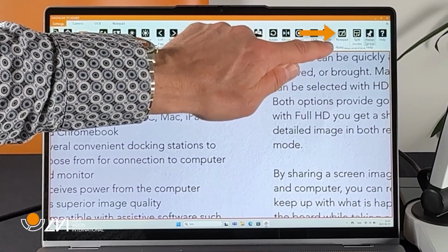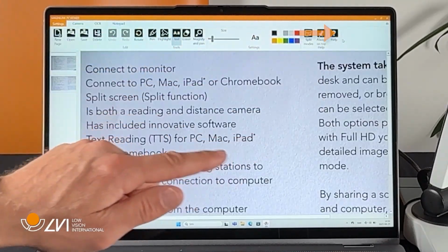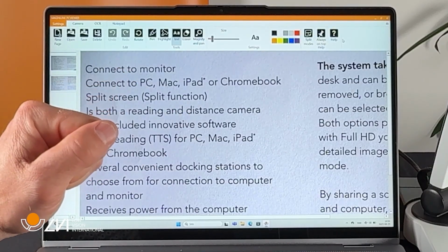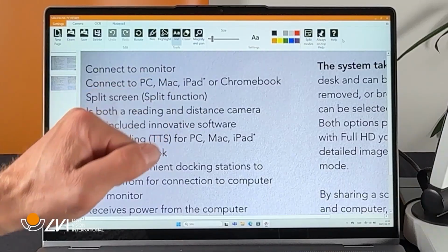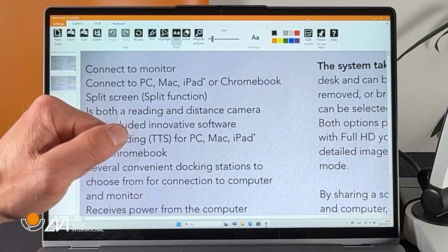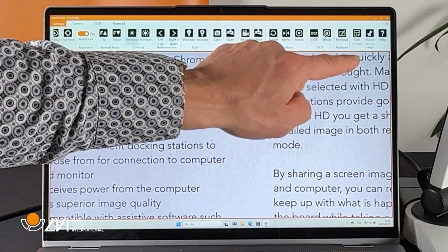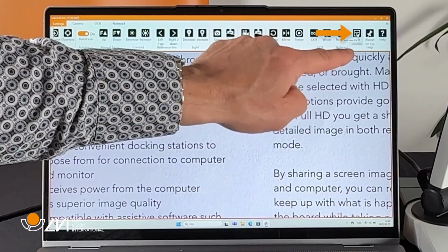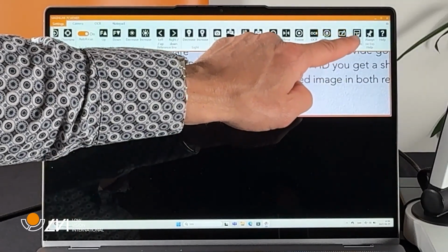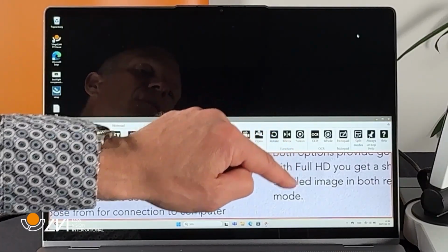Notepad. Press this icon to take an image and show it in the Notepad tool. Here you can write, highlight and add text to the image. Split modes. Press to toggle between different available split modes. Choose between horizontal split and vertical split.